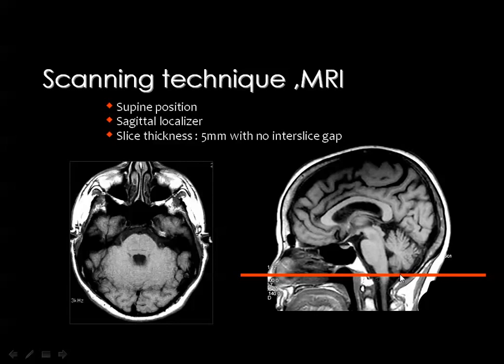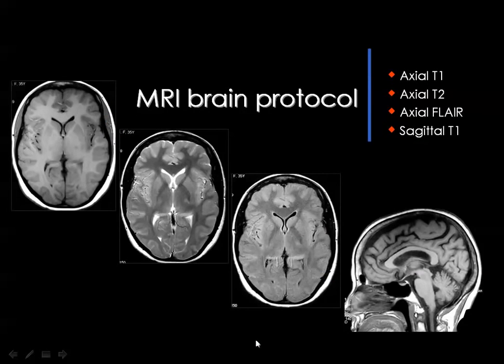Then starting by the region of the foramen magnum, proceeding upward, and in this case, there should be some sections in the brain whenever you are cutting through the cerebellum, and then part of the occipital lobe will be behind the cerebellum, as you can see in this axial image. And this is the cerebellum, and look carefully posteriorly and you see the cortical sulci of the occipital lobes. This is not the case for the brain scans because we have an angle, and this angle usually does not allow cutting the cerebellum and the occipital lobe in the same plane.